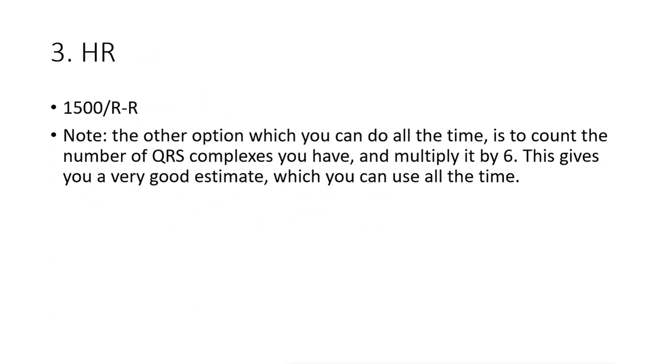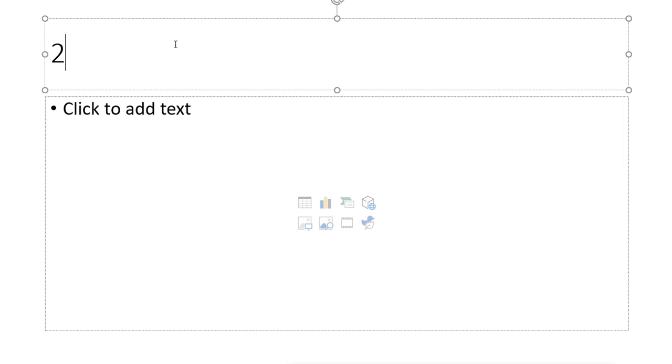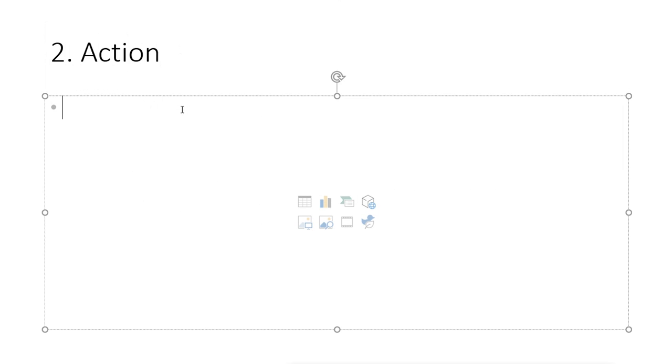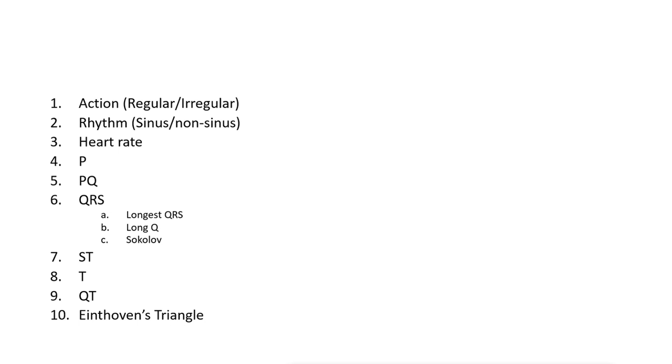Let's just make a new slide right here. Just say, we'll get to that in a bit. Okay, there we go. So third thing, heart rate. Let's keep it simple for now. Let's just cover the heart rate. So the heart rate, how do you calculate it? Again, we're just following these points.